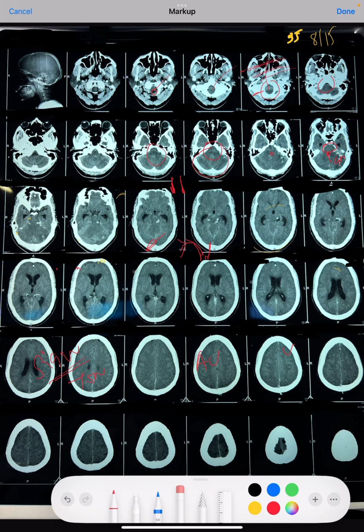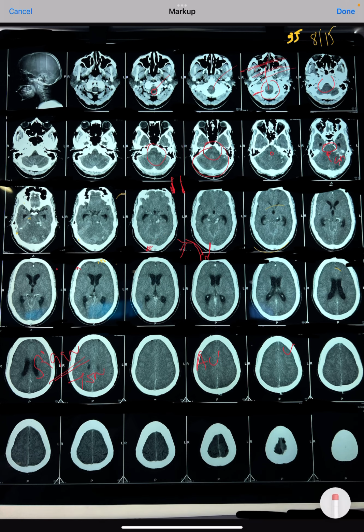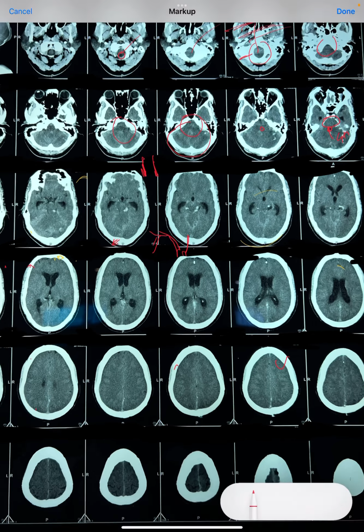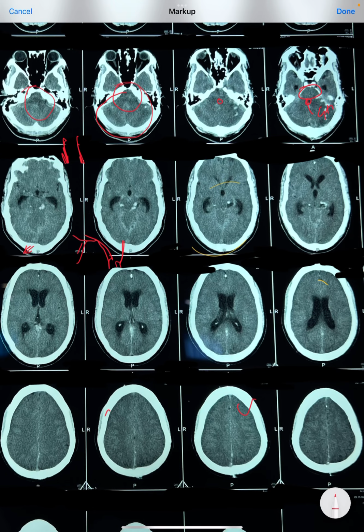Now, how to suspect whether this is an arterial or this is a dural sinus fistula, dural arteriovenous fistula? If it is an arteriovenous fistula, which is getting connected to sinus, sigmoid sinus or transverse sinus, then, as these veins are very, very thin, we can see the tortuosity of the venous sinuses, because these sinuses are actually veins.